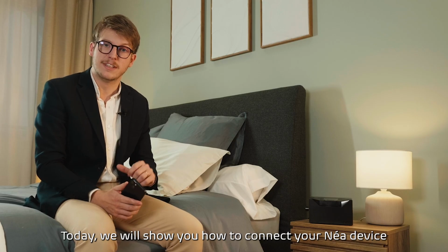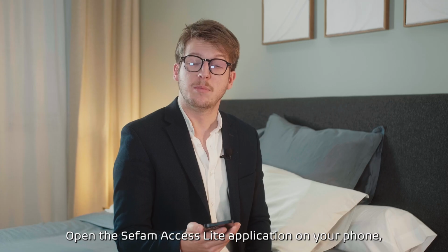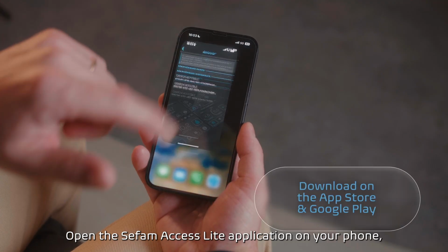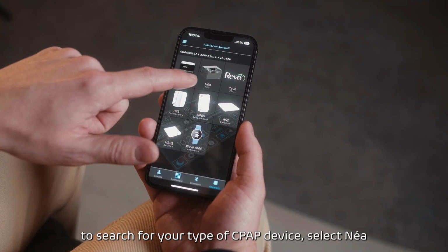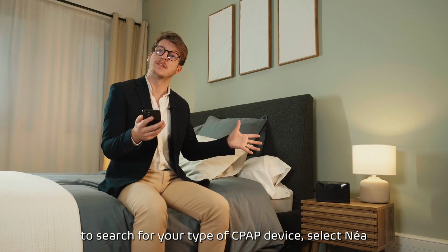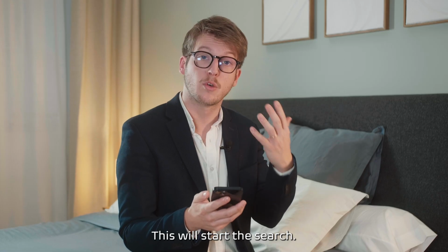Today we will show you how to connect your NEA device to the Sefam Access mobile app. Open the Sefam Access Lite application on your phone. You can then navigate to the Device tab to search for your type of CPAP device. Select NEA. This will start a search.